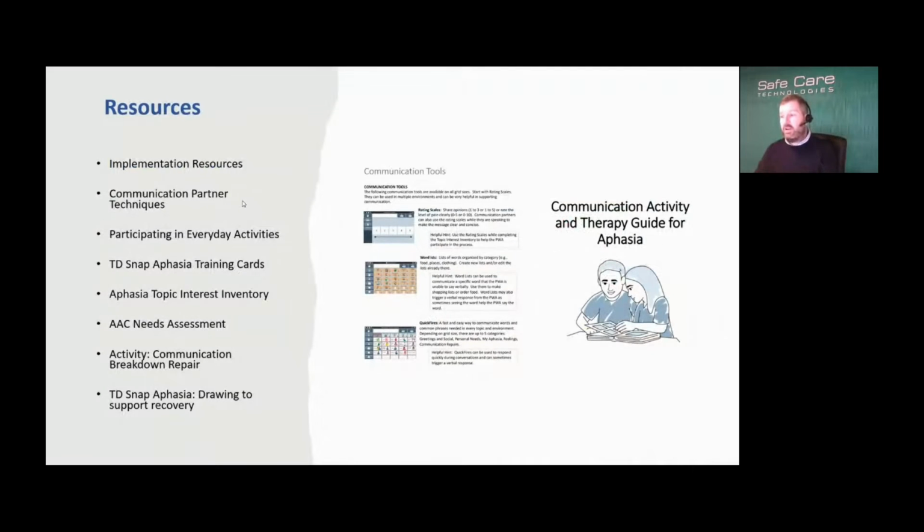So then to support all this, that's a very brief look at just maybe some of the features that aren't in, say, Snap Core First or in the text-based page set that are specific for the aphasia. I'll show you them shortly, but I just want to highlight them.